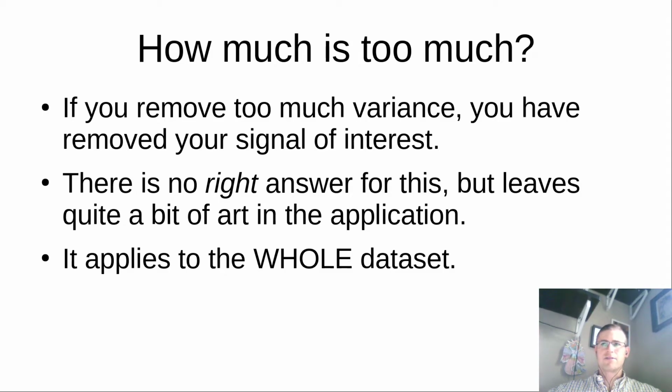So, during the experiment may be very different than before or after the experiment. You could have some overlap because of one or the other fading into each other. Maybe that's a concern for how you apply this. But just be cautious when applying PCA and don't go too aggressive with it.